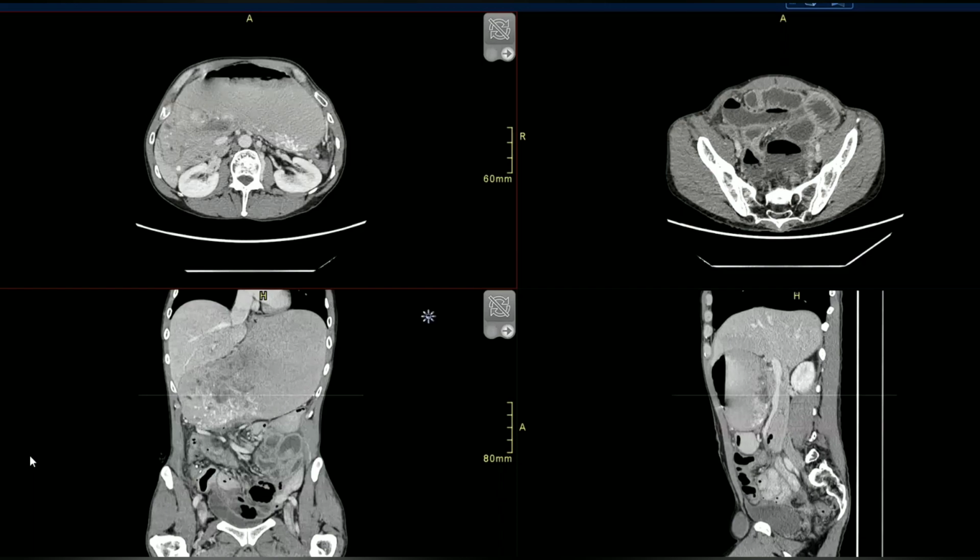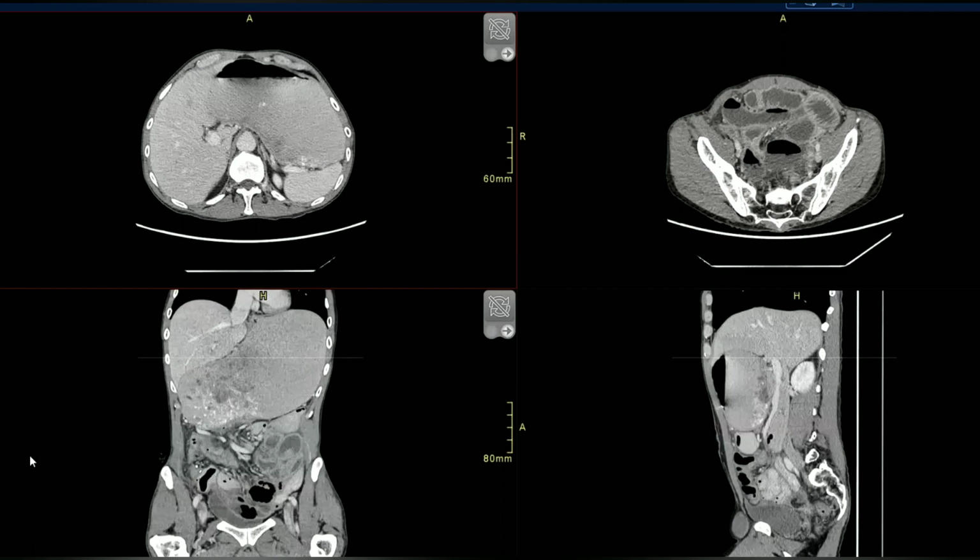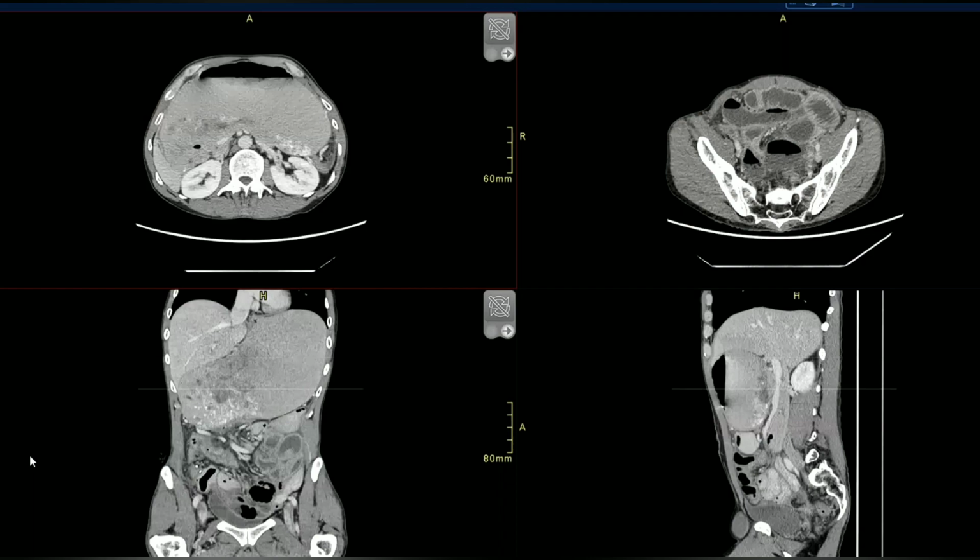This is a massively distended stomach. Yeah. And when it is this much distended, you're going to see this mottled internal content, probably what she's been eating. So we just disregard that, but this is the main thing. So what's happening to the stomach? Why is it distended? What important points do you want to look for in this image?